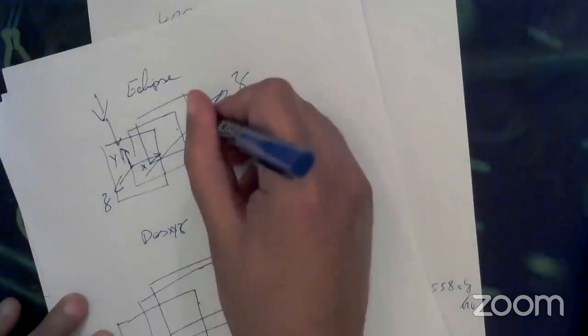Okay. And we have here those X, Y, Z. Okay. What is the coordinate system? The conventional way is that we have, okay, these are like that. These slices are not the same as these. Don't confuse. I'm just showing you what's the coordinate system there. So the coordinate system is based on Eclipse.